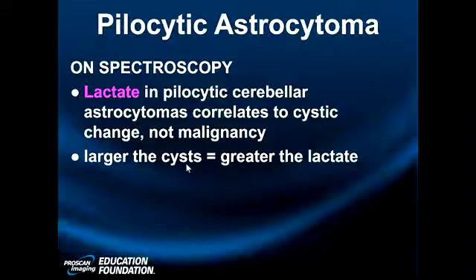They've got lactate in them. And I'm not sure I can explain as a scientific person biochemically why that is, but I believe there is an explanation. I just don't know it, and I should learn it next time I have this course. But lactate is elevated in pilocytic cerebellar astrocytomas. Some have said that this is a useful, when present, differentiating feature from hemangioblastoma. Frankly, I've never had a problem differentiating big hemangioblastomas from pilocytic tumors based on vascularity myself.